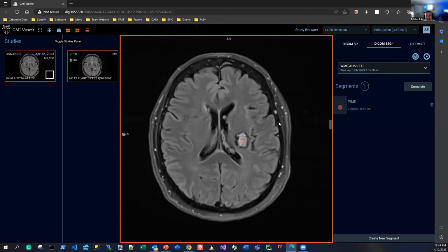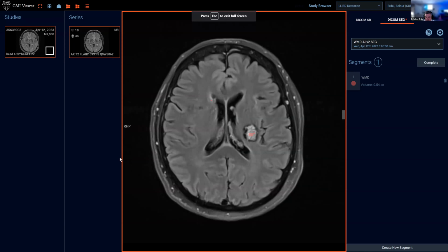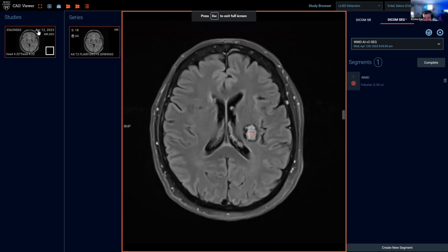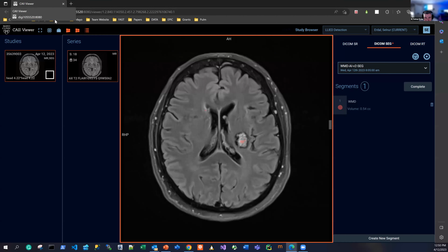Okay, the moment you've been waiting for, MONAI in action. As we discussed earlier, MONAI was intended to answer: how do I take my algorithm, deploy it within standards, and clinically deploy it? Here's an example. In this case, it's a web-based browser. It's running in the browser, but data is flowing to it from my end.